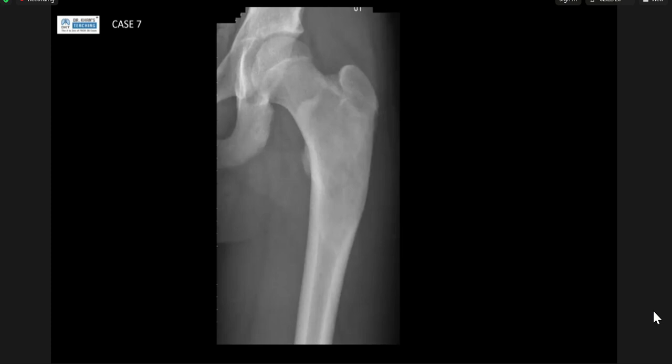Okay, I see this is a radiograph of the femur. I see there is a wide expansion of the intertrochanteric region and the proximal shaft of the femur. There is a ground glass density of the medullary cavity with expansion. There is no cortical breaching. The upper end shows a clear edge of the pathology. The lower edge is continuous, not ill-defined, no soft tissue mass.